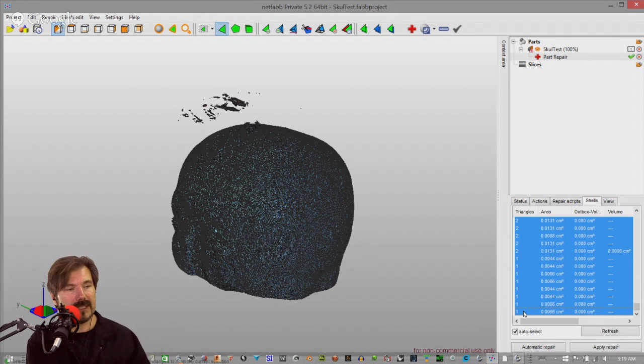You can use the 3D Slicer to come up with the model and then bring it into NetFab or even Meshmixer, which is a free program from Autodesk, to clean up the print object even better, and more importantly, determine if it is print-worthy. And once we do that, we could reduce the size of it. So if you don't want to do a full scale, you don't have to. Most printers will do full scale as well. But once this finishes, it gives me time to.